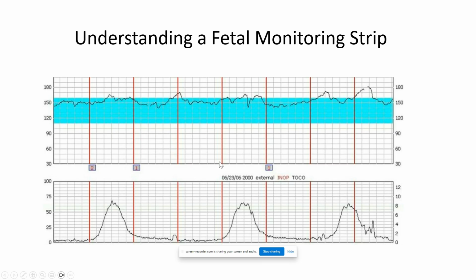Now, these grooves right here is what we want. We do not want to see smooth lines on our fetal heart tracing monitor. With these fluctuations, the ups, the downs, the grooves, those are very good indicators that our baby is well oxygenated and is doing well.